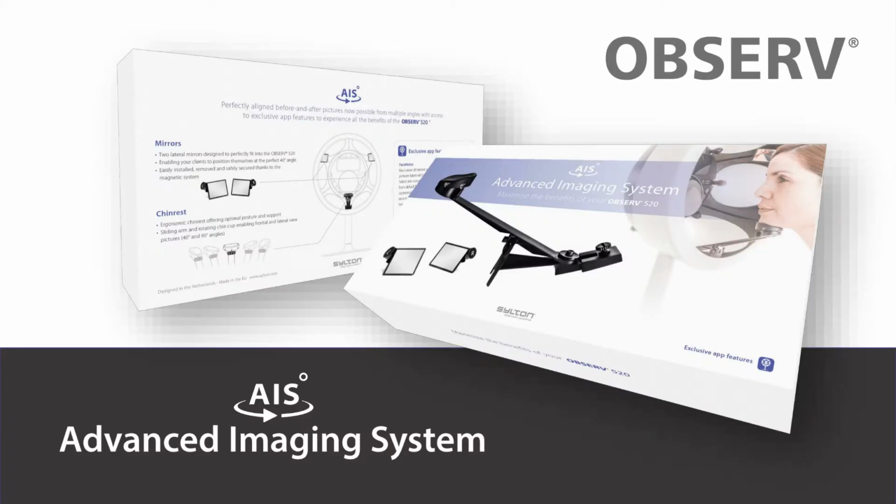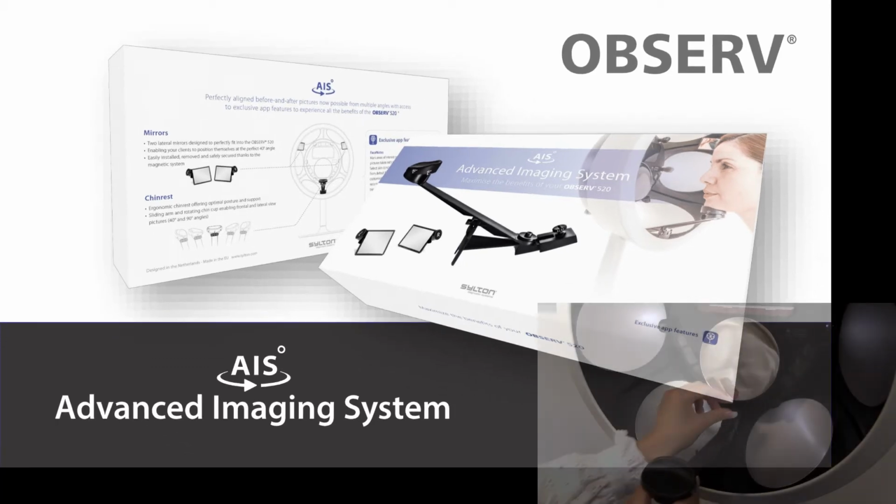On the picture you see the packaging of the AIS. Inside the box you will find the AIS chin rest and the 2 lateral mirrors. The box also includes an extensive user manual that explains how to install and use the AIS, which we highly recommend you to carefully read before using the AIS.